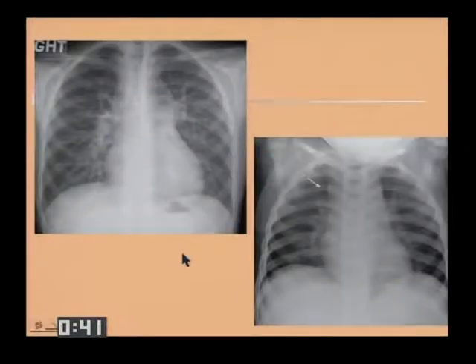The superior mediastinum can also be a little wide with non-mass-like lesions. If you notice, the heart here is normal, but the vessels are a little prominent. If you remember the term snowman or figure of 8, that calls to mind patients who have total anomalous pulmonary venous return with a vertical vein, supracardiac drainage of the common pulmonary vein, the vertical vein, into the superior vena cava.